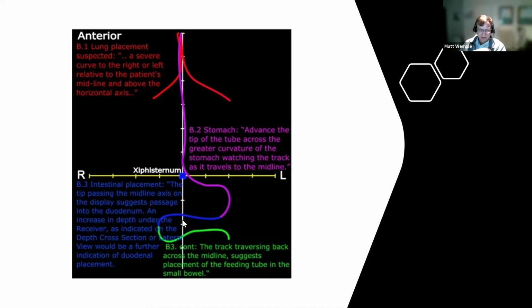That's when you know that it's post pylorus, because that means it's turning down the duodenum, further down the duodenum. And you're probably not going to be placing, the nurses are not going to be placing, a bedside feeding tube this far down. But this turn here is what I use to judge whether or not it's out of the stomach.